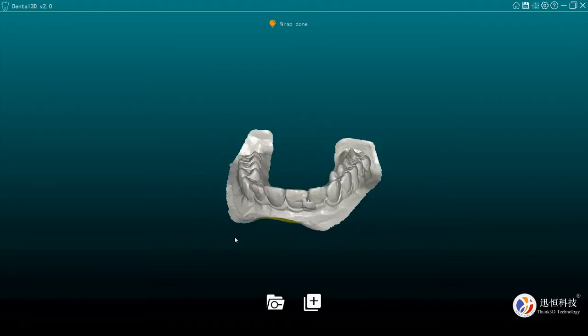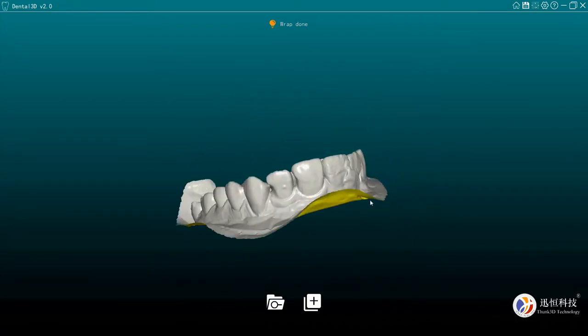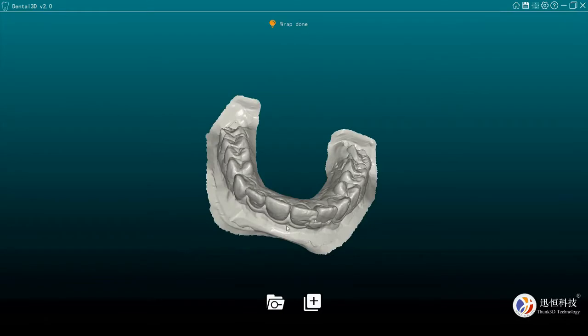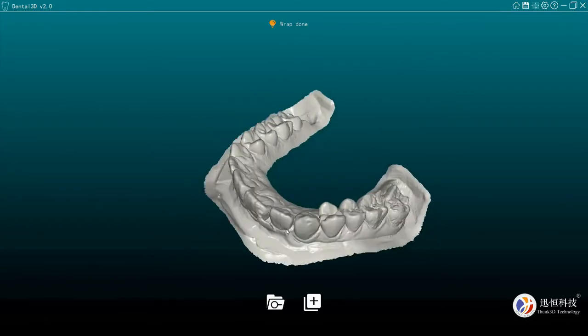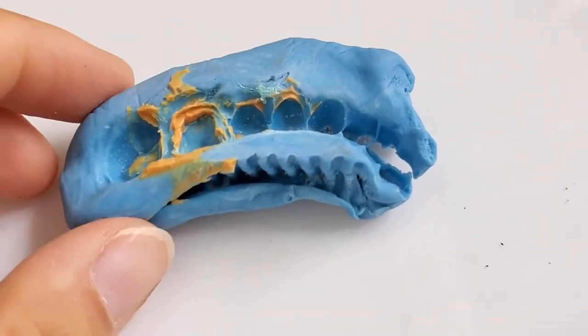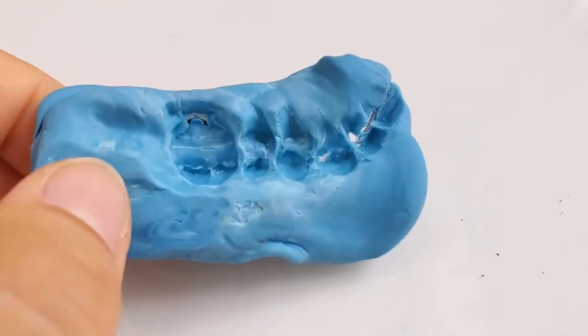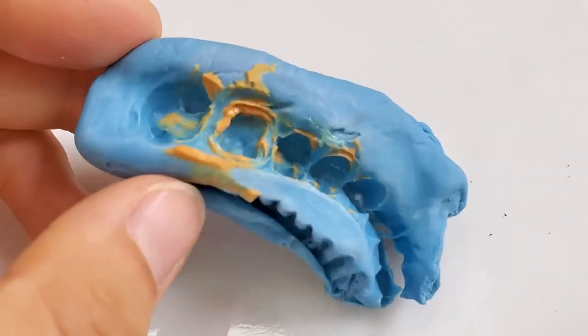For the exception examples, a handheld scanner could perfectly handle it. The stationary device indeed has the limit to scan very deep areas. Next, let's try the bite impressions. Dentists are quite familiar with it. The difference from the last impression is the bite relationship.